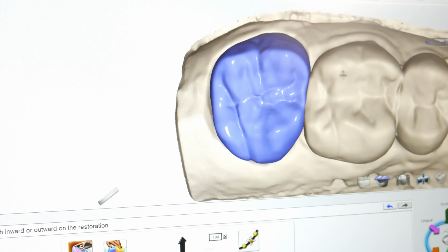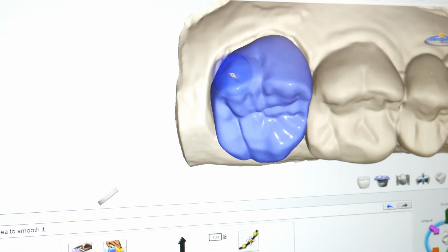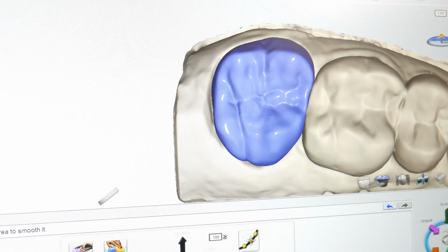Not everyone's one size fits all. You really got to pay attention to your surroundings and adapt to that. Otherwise, it feels like an alien tooth in their mouth. It's just not natural for them. So pay attention to those small details.